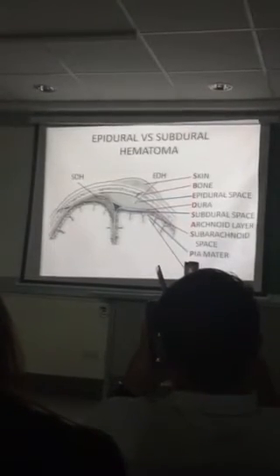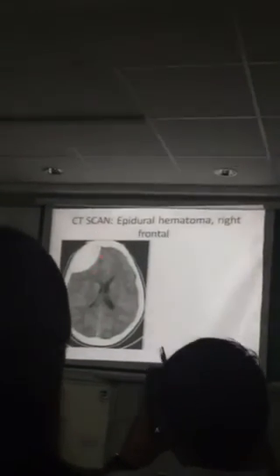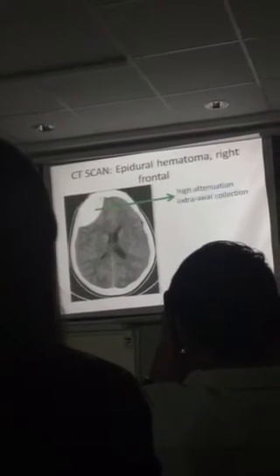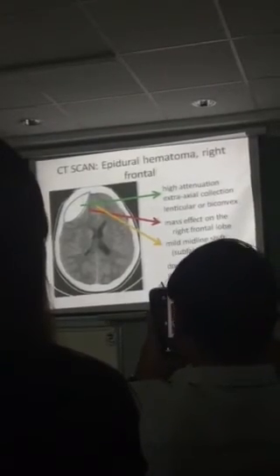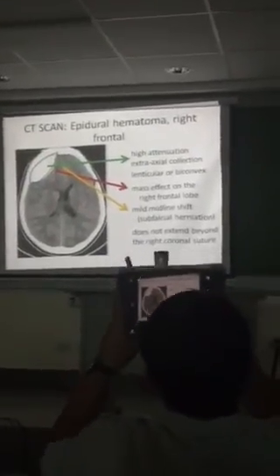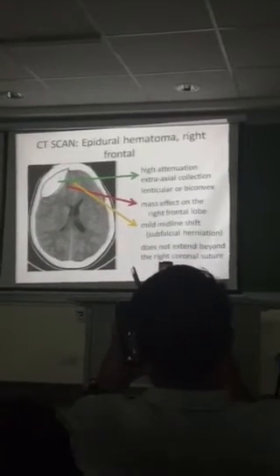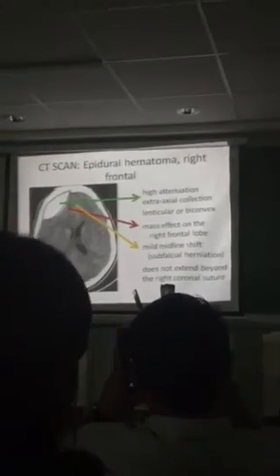Okay, let's differentiate epidural from subdural hematoma. So epidural, imaging modality first. What is this? CT scan. So epidural, of course white because blood is white on CT. Usually lenticular or biconvex. It does not extend beyond any suture line. Those are the differentiating factors of epidural versus subdural.